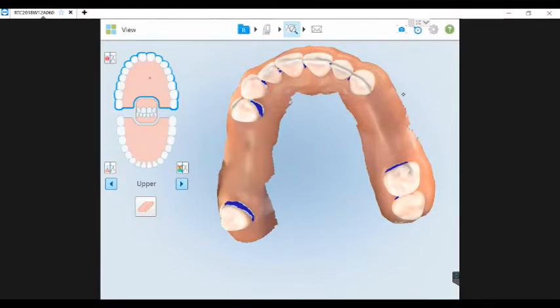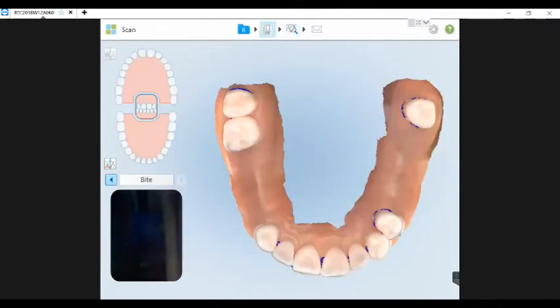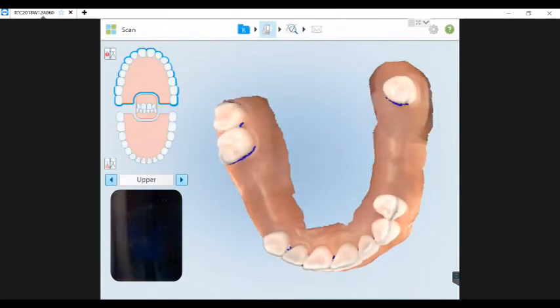Oh, Kelly, you're in post-processing. Ah, thank you. I did want to post-process, but not to show the fill tool. Thanks. There we go. All right.